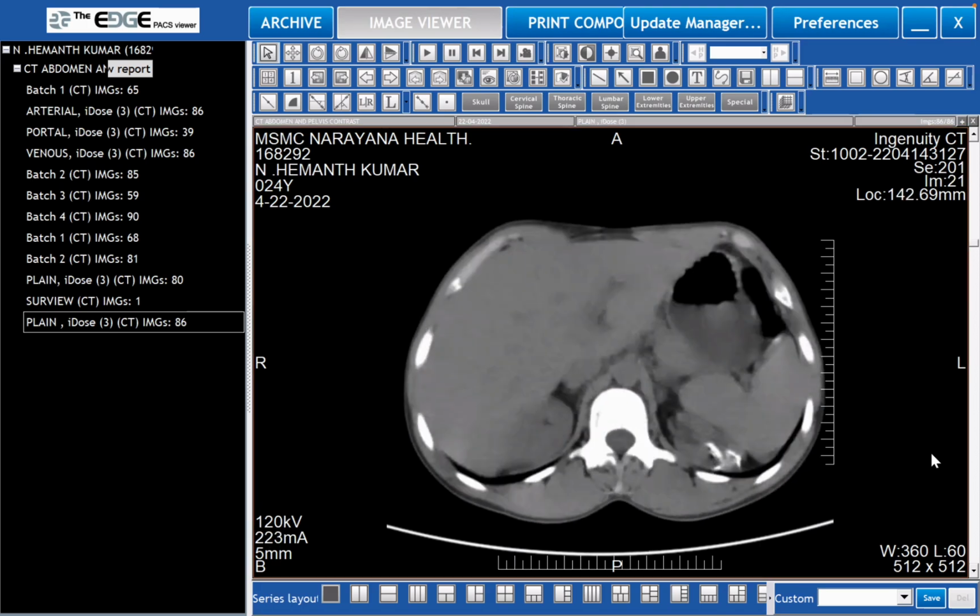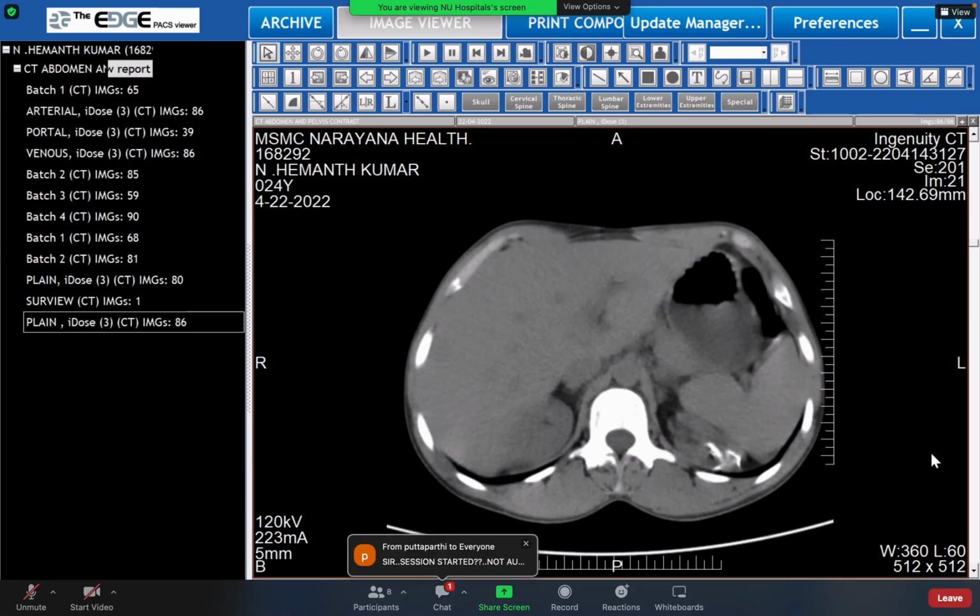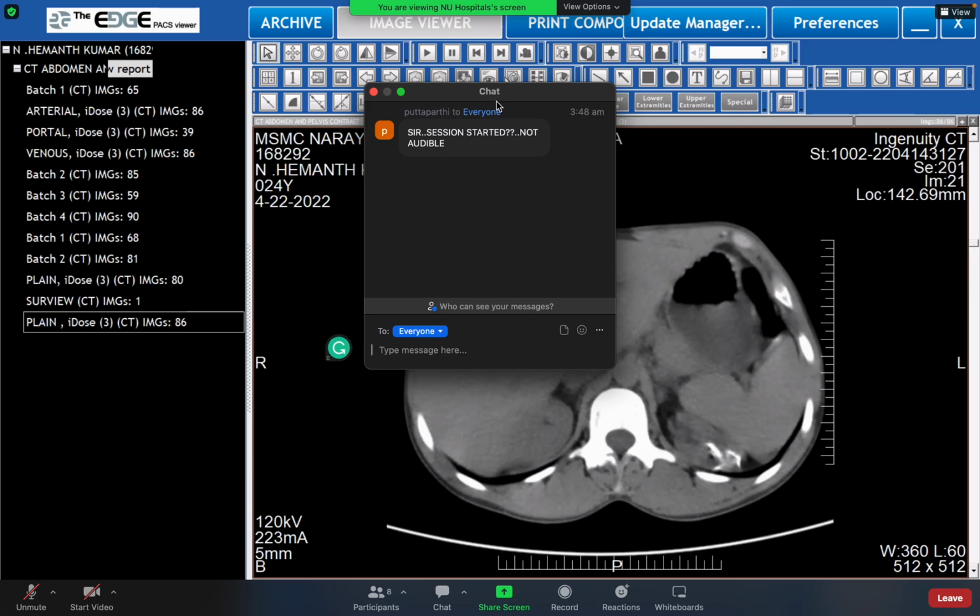You look at this particular thing. In this cut, you can see the perinephric stranding is there, and also calcification. Does this look anything like a stone? No, sir. It's a very bizarre shape, isn't it? Yes. And you see at that point, there is hardly any cortex. In fact, some of these areas of calcification seem to be outside, on the surface of the kidney.